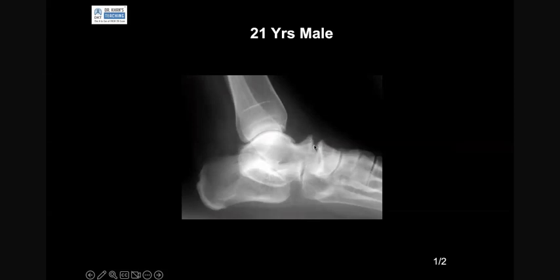Here, you can develop your eyes on another sign. This is the talar beaking, but look at this. This is known as the C sign, and it gives you the appearance of a C. Together, the projection of the bony sustentaculum tali as well as the posterior portion of the talus gives you the C sign. So you have to develop your eyes on this sign.